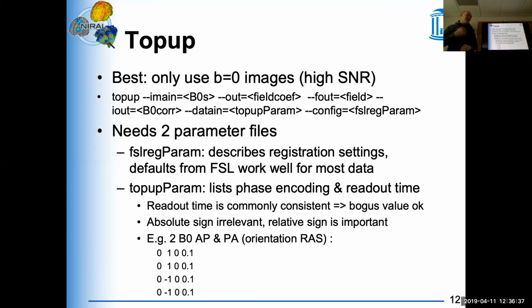I've actually never looked into it for our monkeys whether we could optimize these, because obviously these have been optimized for the human setting. So even for the T2, I didn't look at that. So do you have to change anything for the T2? I don't think so. I mean, because it's more related to resolution and so on. Yeah. And when you use the T2 as a target for the undistortion, what you need to do is register the T2 and resample the T2 in the space of the DWI. So now it has the resolution of the DWI. So in that sense, it shouldn't matter.